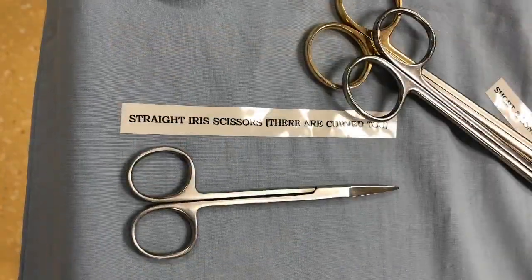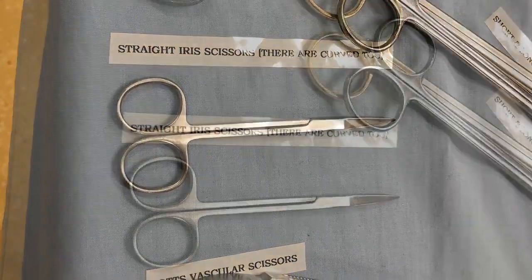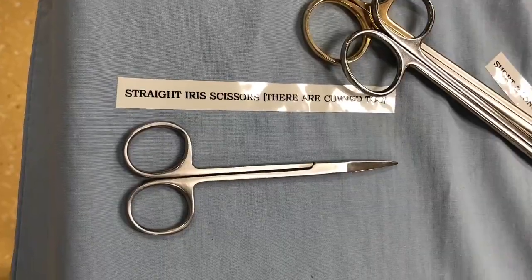Remember, all instruments come in pediatric size, smaller for our smaller patients, and bariatric or longer instruments for our deeper surgical cavity needs.